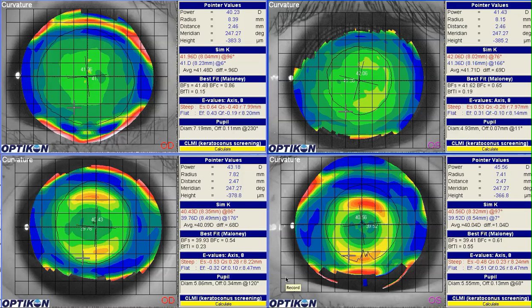In this orthokeratology case, the patient has some residual myopia after wearing lenses. If we look at the pre and post treatment topographies, we can see that the optic zone could look a little bit better, but this person's not a super high myope, so we're probably not going to get a very, very well defined reverse curve.